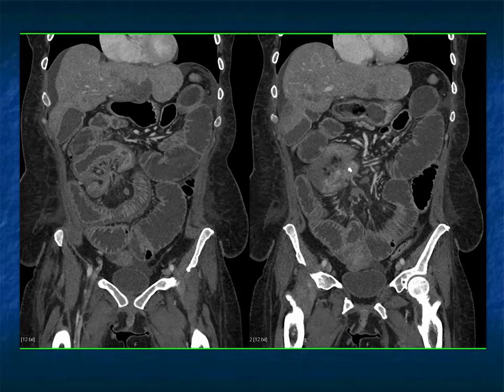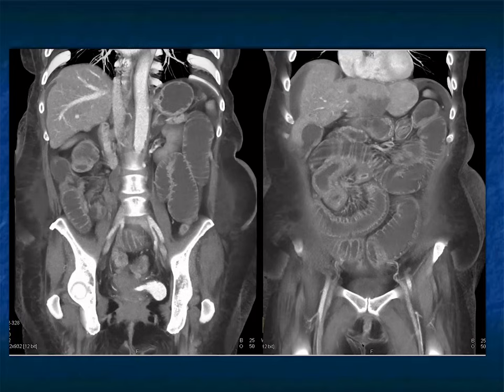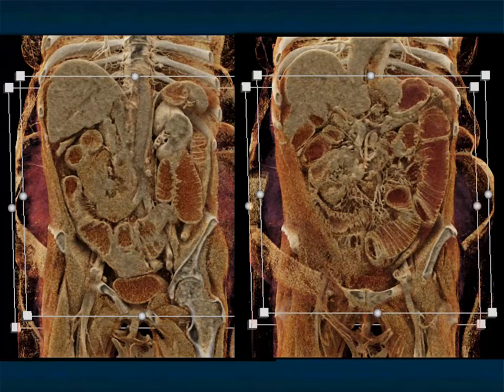We are better at finding the tumors now as we do dual phase imaging and thin section CT, but even with the best protocol, it can be difficult to see the primary carcinoid tumor. Sometimes nuke studies like dotatate studies can be better at finding the primary tumor. But again, put all the information together and think about the transition point, and in this case, the patient's carcinoid tumor.